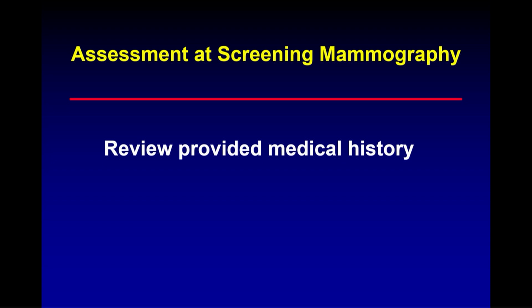So if you see an asymmetry and there's a previous excisional biopsy and it was substantial, you have to go back and look at the pre-surgical images, then that explains the asymmetry. So it doesn't happen that much because we don't do that many excisional biopsies anymore, but it happens.